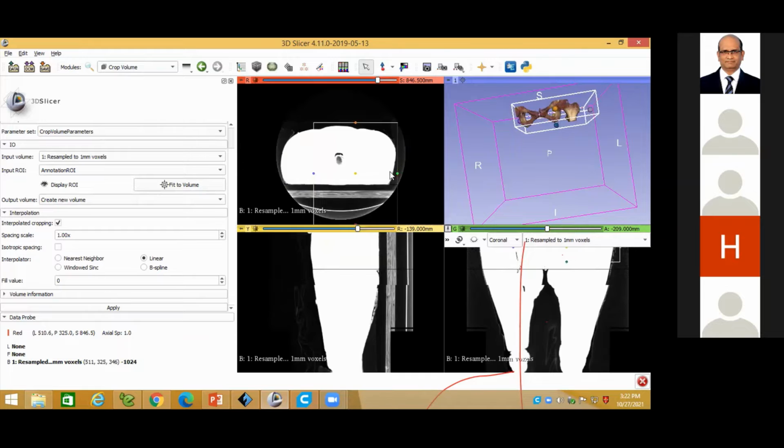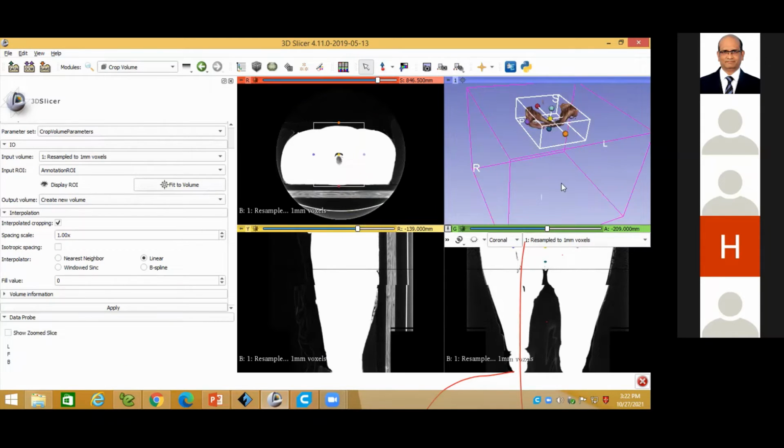Next here also, I don't require this one. When I go here, something is also going to be damaged, so that's why I'm choosing this also. Now you have to adjust this length also. You have to press it and drag it here. Now you can see, from the total tissue we have extracted what we require. I require only this region, so the remaining images I'm going to remove using the crop volume option here.